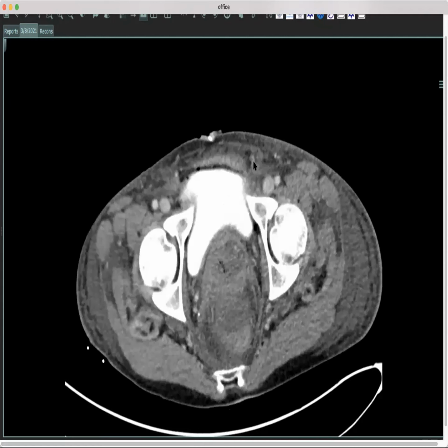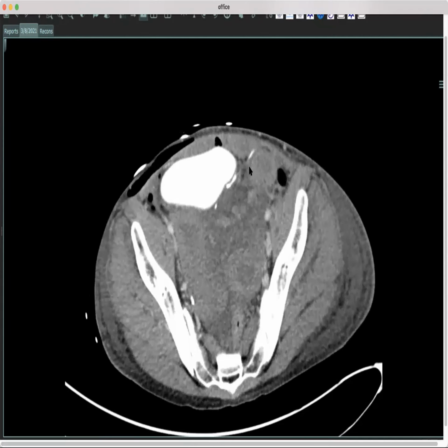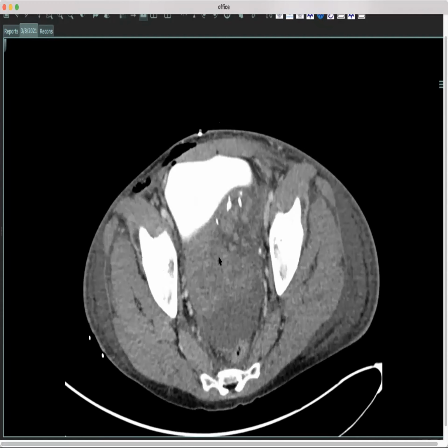And in this particular case, they actually left a Doppler lead, this metallic wire that runs along the course of where you might imagine the epigastric would supply this bowel. This Doppler lead is left in after surgery for a little while, so they can monitor the health of the segment. And so when they called me, what I thought is that this bowel looked really sick to me.